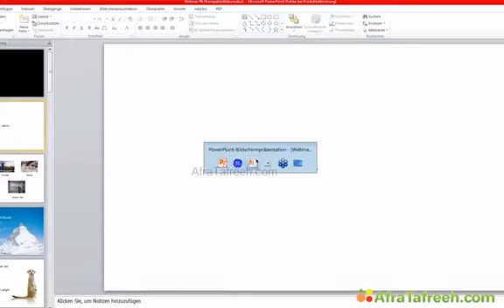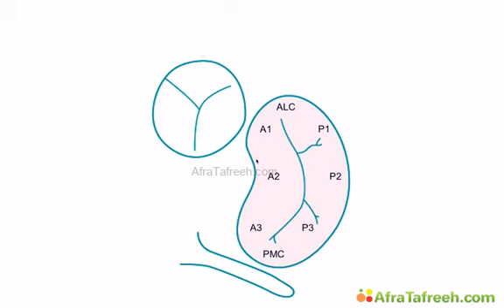Okay, now to the next case. Oh yeah, this is just a diagram which shows you what I just displayed. This is the mitral valve. This here would be the anterolateral commissure. This is where we had the problem, which is kind of in close proximity to the aortic valve. So this kind of helps you. The aorta helps you to see which part of the mitral valve you're actually imaging. So in the 5-chamber view, you would have the aortic valve and also the anterolateral commissure.